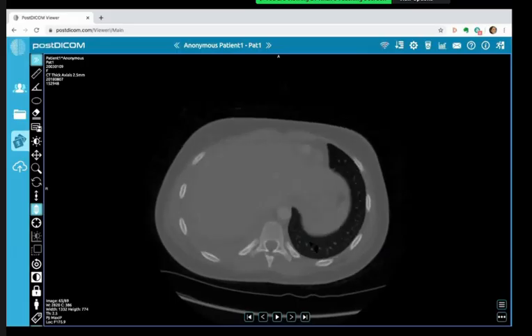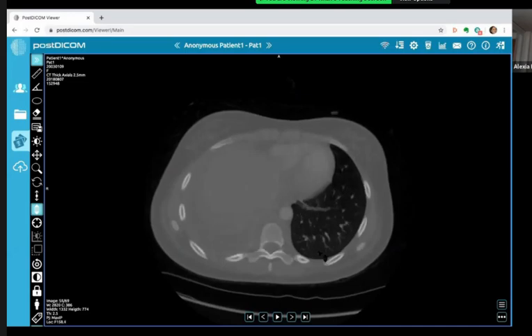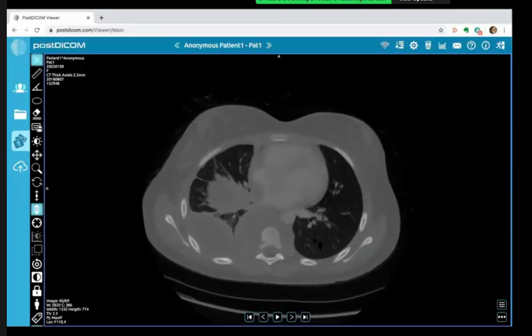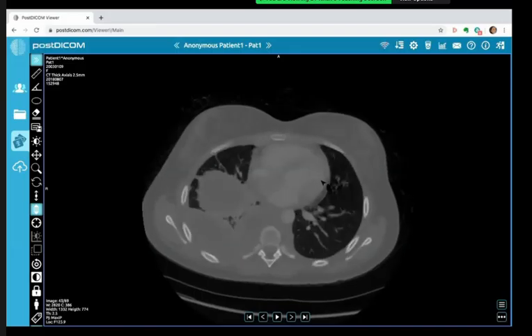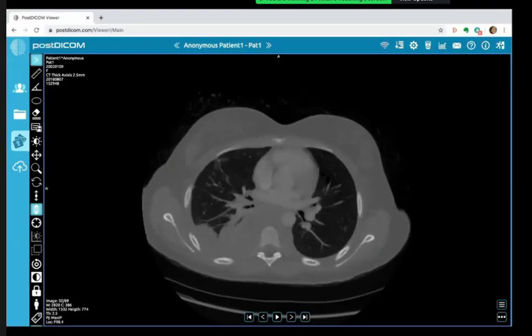Yes. Now on bone window, have a look at the area around the spine. It's extending on both sides of the spine as well as a large paraspinal abscess. And there is ill-defined irregular erosion of the right side of the lower dorsal vertebrae. So it's complicated by spondylodiscitis. Yes. This is an emergency, of course, and I would like to inform the neurosurgeons as well as the cardiothoracic surgeons.